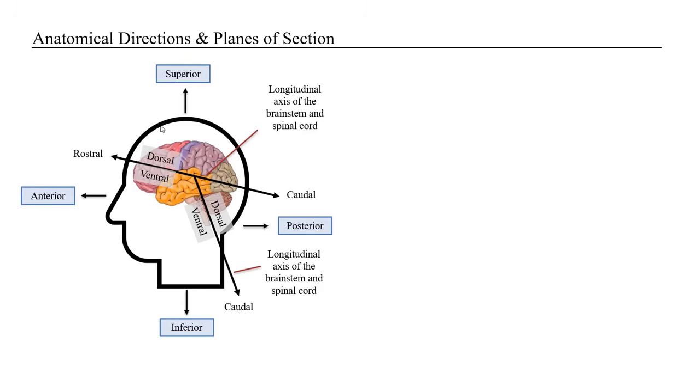The next thing you need to do when you're looking at an MRI is get yourself oriented in space. So we need to review anatomical directions, as these terms will be used clinically when referring to various slices in 2D. And the best reference for orienting yourself in anatomical space for the nervous system is to use the neuraxis. The neuraxis is a line that's drawn along what would have been the embryological neural tube.